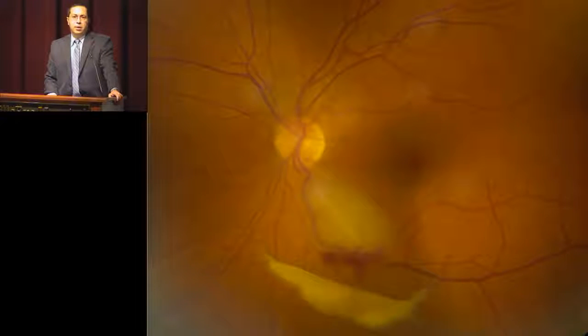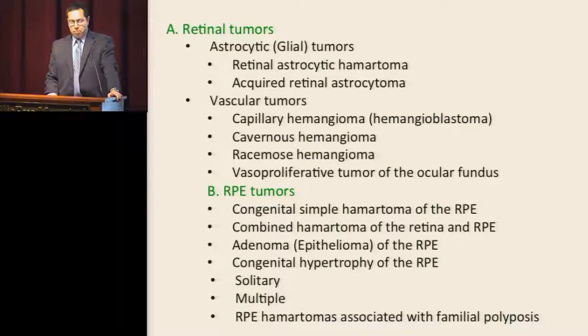So, anybody wants to say what diagnosis we have here? So this is retinal astrocytic hamartoma.